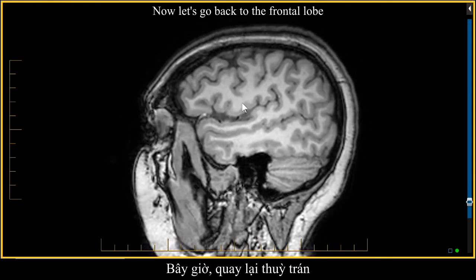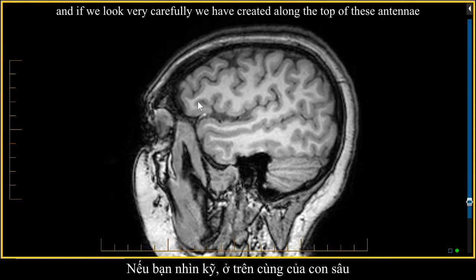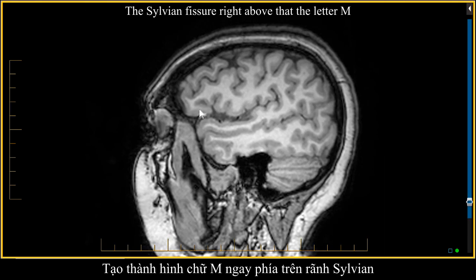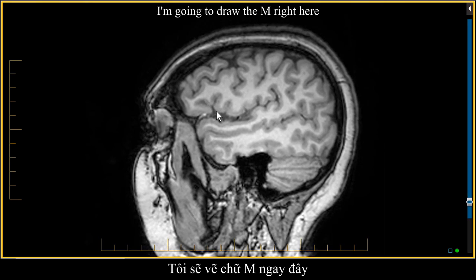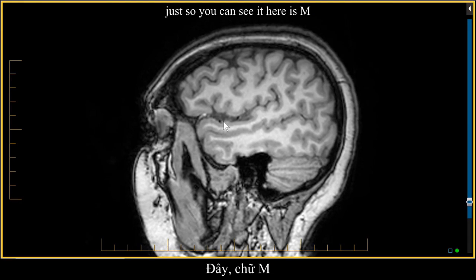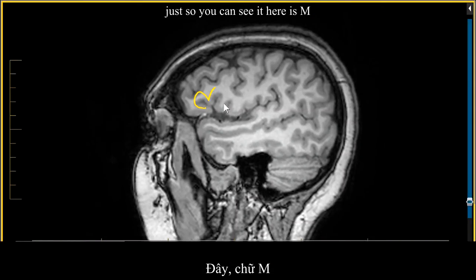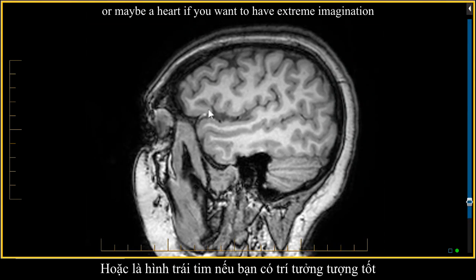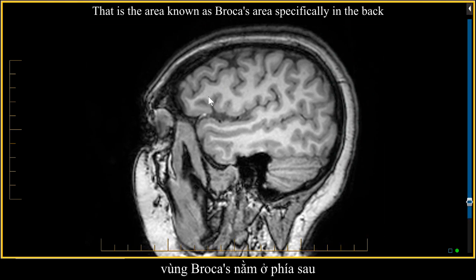Now let's go back to the frontal lobe, and if we look very carefully, we have created along the top of these antennae, here is the anterior horizontal ramus and anterior ascending ramus of the Sylvian fissure. Right above that, the letter M. I'm going to draw the M right here, just so you can see it. Here is M, or maybe a heart if you want to have extreme imagination. And that is the area known as Broca's area, specifically in the back.